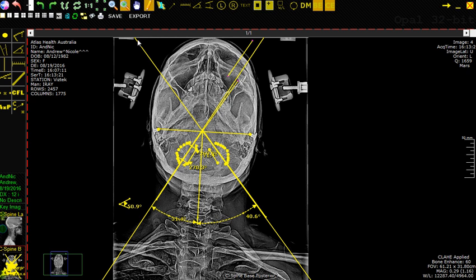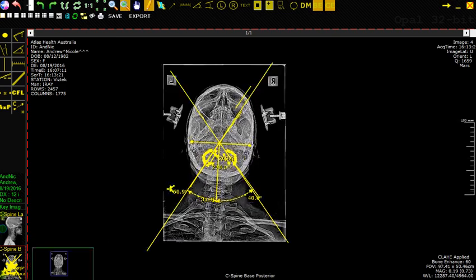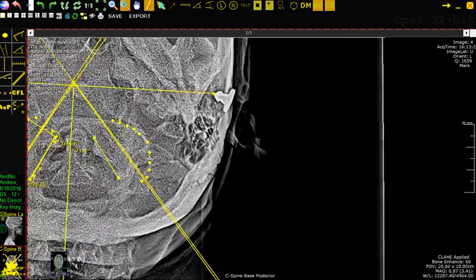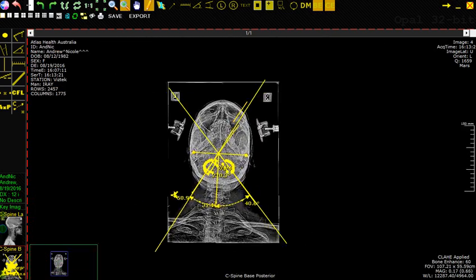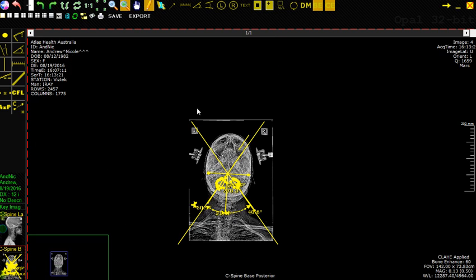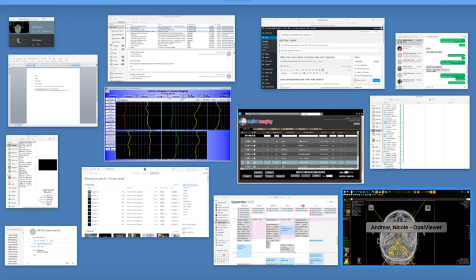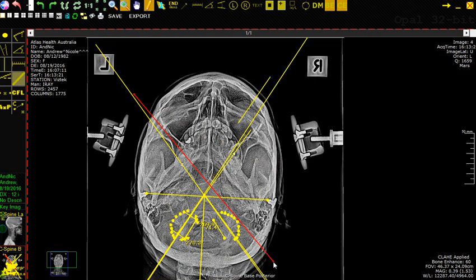So again, let's be very finicky. What I'm going to do in this case, shoot, I did that wrong. Again, this is not my normal computer, but we'll get there. Okay, this will work. Okay, I know what I'm doing wrong. I need to have the tool. So what I'm going to do this time is draw a super duper long line that is a bit overkill, but what this one's going to let me do, that one seems to be about perpendicular.